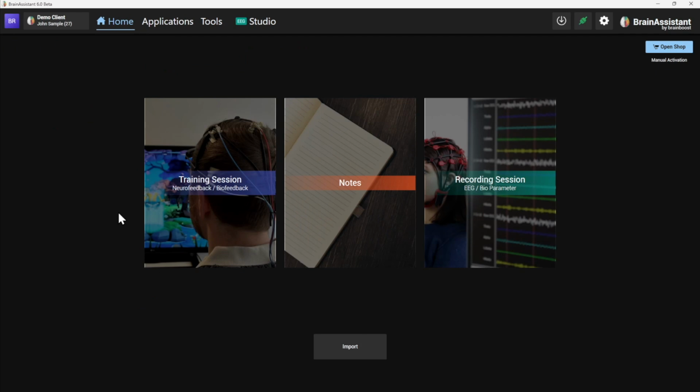So I know with the Nexus device at this point, it will be a recording in their software, and then you export the EDF and import the EDF here. So working with the flow, when you have a Nexus 32, for example, I know this will not work.